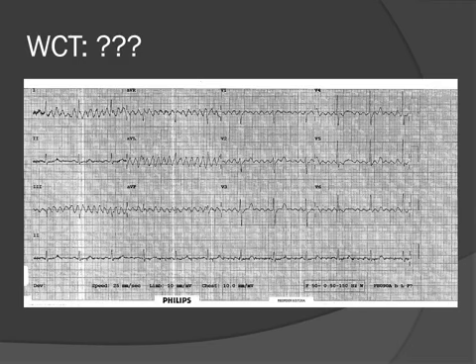So the final ECG is just one to keep you on your toes. If we had to look at lead 3 or lead AVL, you'd be pretty concerned that this patient may have had a polymorphic VT, for example. It's very fast, it's quite irregular, the complexes look awful and wide. The patient was feeling pretty unwell, which confused one of the people looking after them, thinking, oh, he's having intermittent runs of polymorphic VT, then going back into a normal rhythm. Maybe they've got atrial flutter because there's what looks like a flutter wave here.